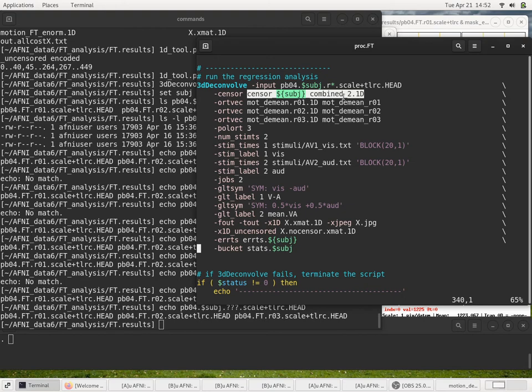The reason the full model is created first is so that we have time continuity. So it knows where the run breaks are. It knows for each event how long the stimuli last, well, we tell it how long the stimuli last and how long to convolve a model by. For the slow drift fitting, it needs time continuity for that. But once it develops the whole model, then it can remove the time points that we want it to remove.